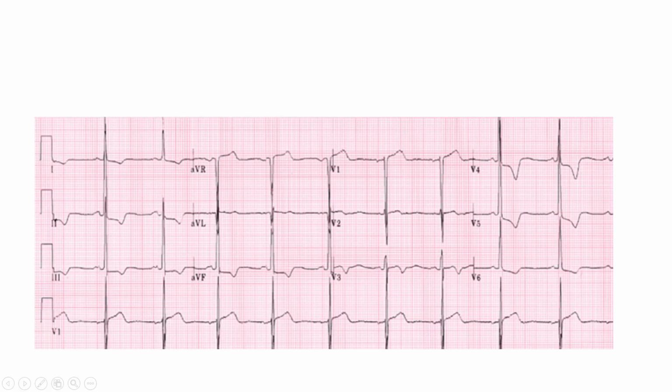Let's have a look at this 12 lead EKG, and we're going to look directly at indicators of increased chamber size. Now, if we look at lead, a little bit of bumpiness here, and this P wave looks a little bit prolonged, so we're going to say possible left atrial enlargement. Now we're going to move on to our ventricular indicators of hypertrophy. If we look at the negatively deflected component, or the S wave in V1, and then we look over here in V6, you can see that these amplitudes are easily going to match up to be greater than 35 millimeters. In fact, this one is so deeply negative that it's actually interposing on the lead below it. Here we have definite increased amplitude in the QRS complexes.